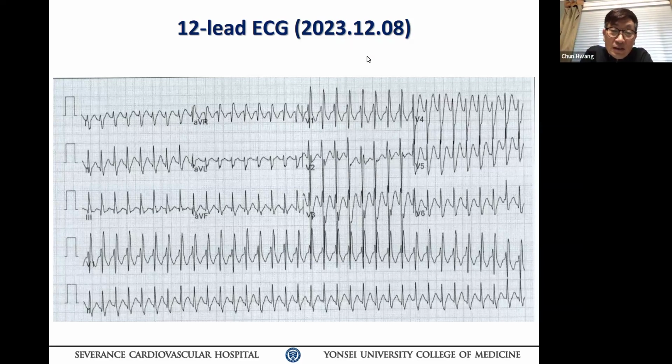You see it? In the V2, first, third, fourth complex, 네 번째 컴플렉스 가시면은 거기 조그만 너칭 있지, 뒤에 터미널 그게. 예, 그 다음에 가서요, 그 다섯 번째 가봐. 네. 예, one more. Yes, 그 너칭이 바뀌었잖아. 그지, 계속 바뀌어 이 너칭. Why is that? 이게 aberrancy면 이게 consistent with that?